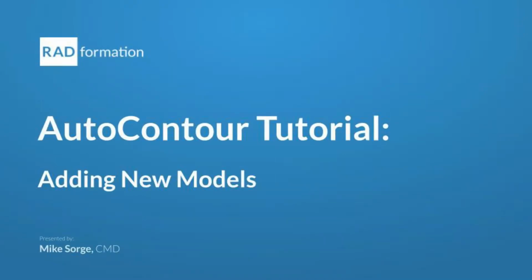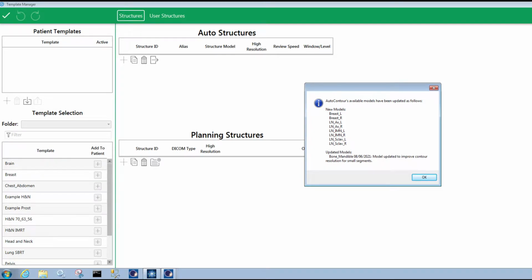Hello, welcome to a tutorial on AutoContour, editing your structure templates after a new model is released.